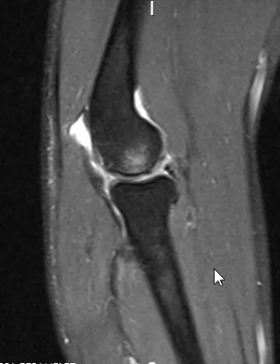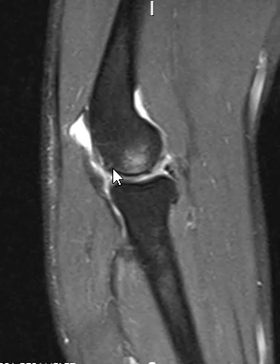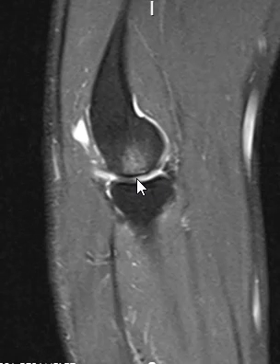This is a sagittal image here. Here's the capitellum, radius. You can see that fog of marrow edema. The osteochondral defect is not well seen, but there is a shallow cortical defect, and again, the articular cartilage is absent there. So again, an osteochondral defect of the capitellum.